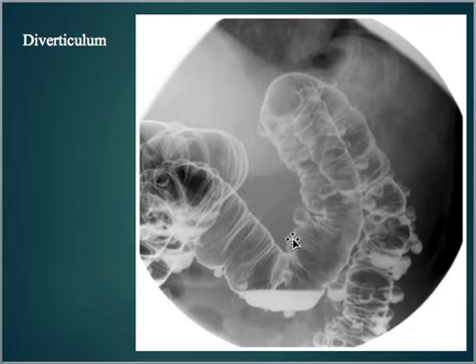But remember, normally the intestine has a nice smooth border on the edge, like this here. But if you look at this person, see all these little round pockets or outpouchings? There's one down here. These are diverticulum. These are outpouchings in the lining of the intestine. A weak spot happens to pouch out.